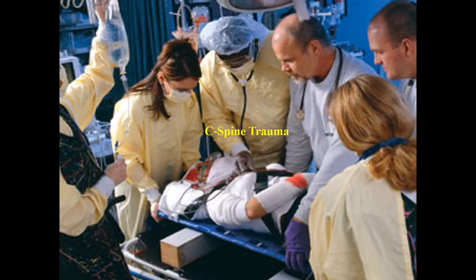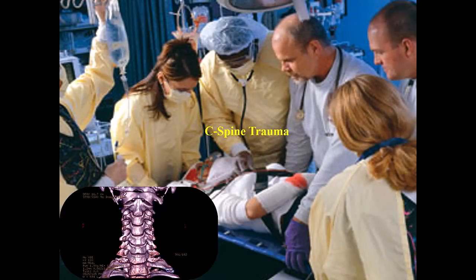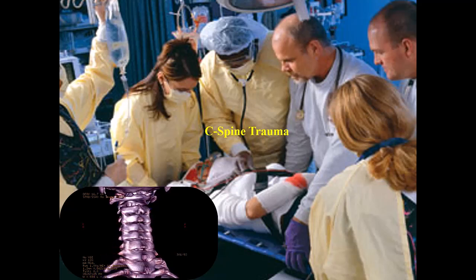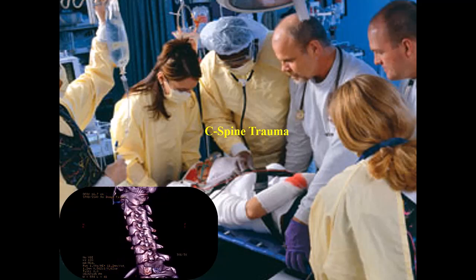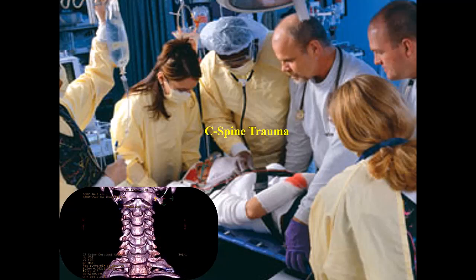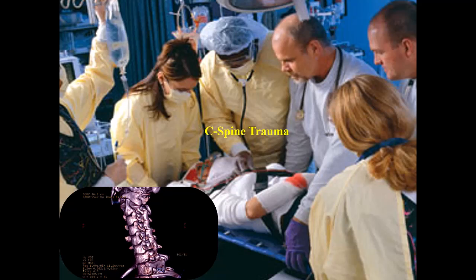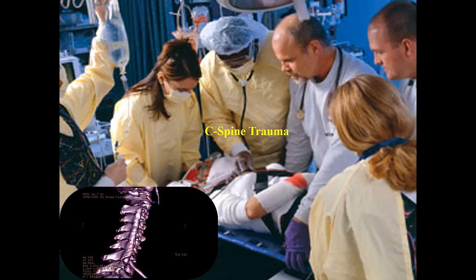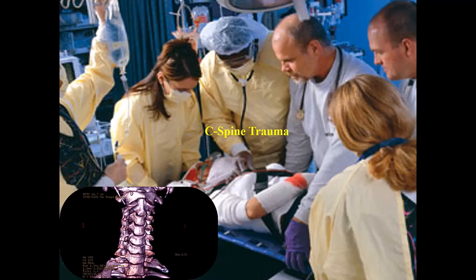An adequate cervical spine series includes 3 views: a true lateral view, which must include all 7 cervical vertebrae, as well as the C7-T1 junction; an anterior-posterior view, AP, and an open mouth odontoid view to visualize the dens.